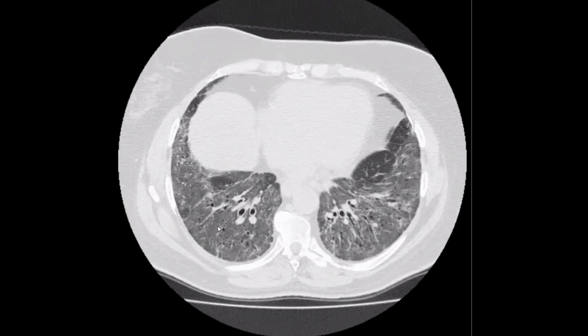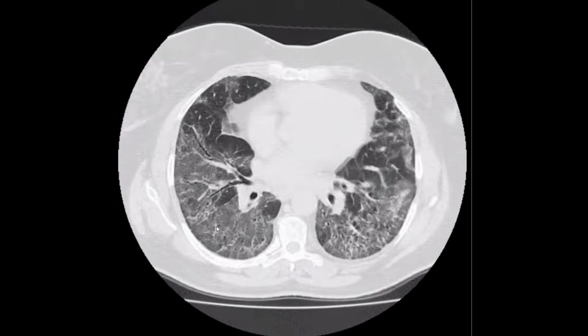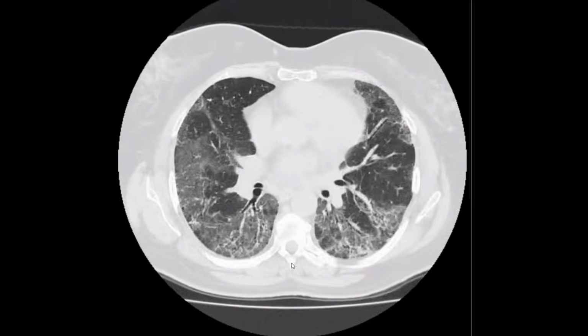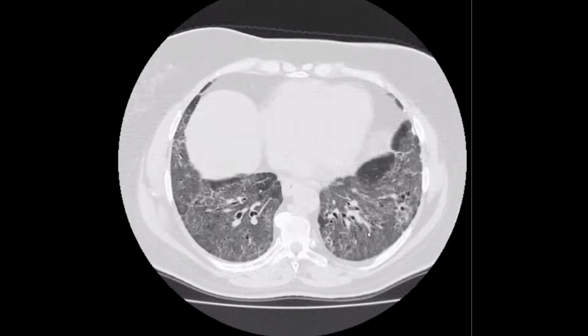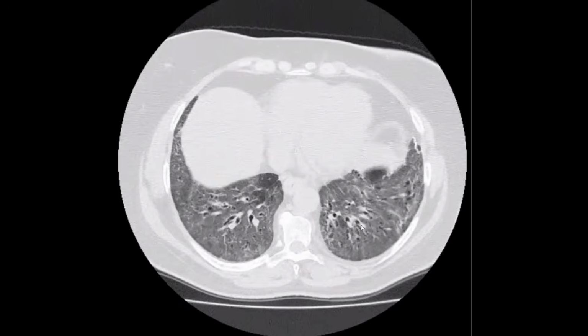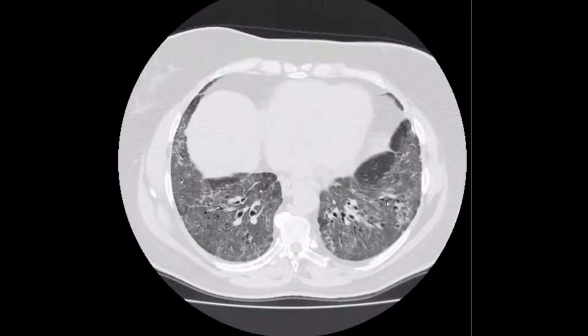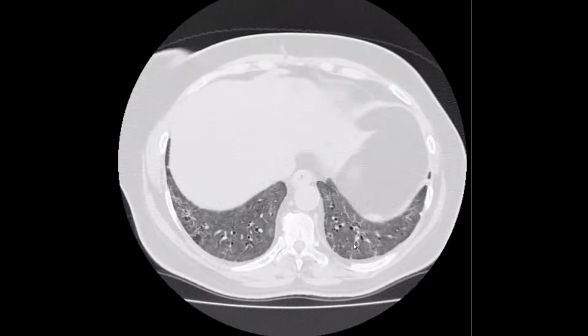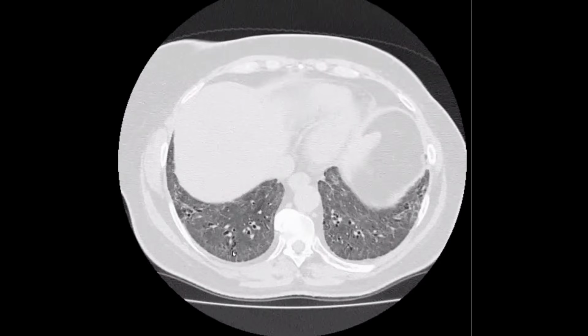Okay. Let's again because you told me very good signs. We have ground glass opacities, yes, and the distribution is very important in this case. We have basal lung distribution, a little bit subpleural. Okay, but the predominant feature is ground glass, and for sure we have ground glass because we have dark bronchus sign. The density of the bronchus is much darker than the lung parenchyma, so we have for sure ground glass with minimal bronchiectatic changes and minimal reticulations.